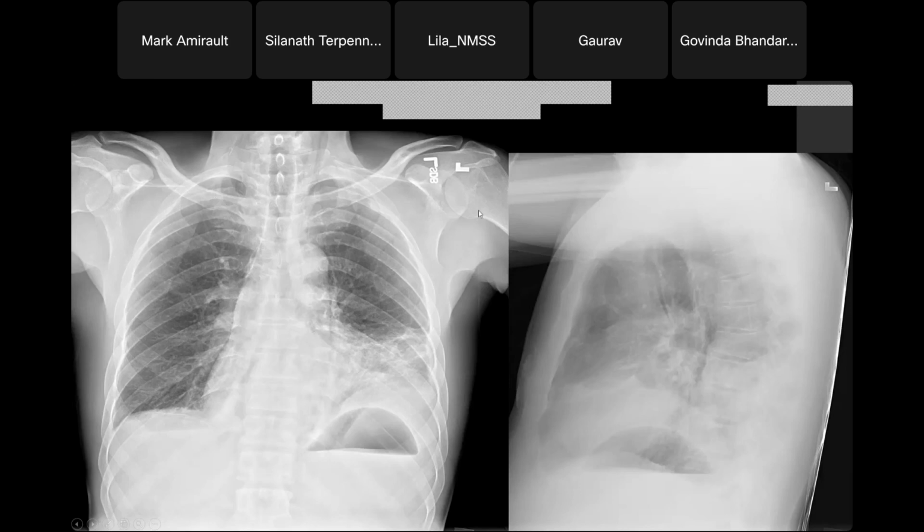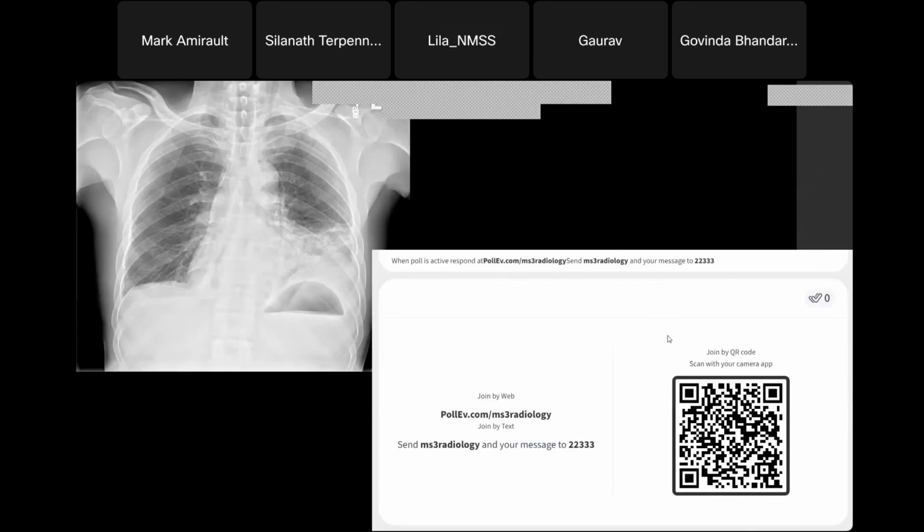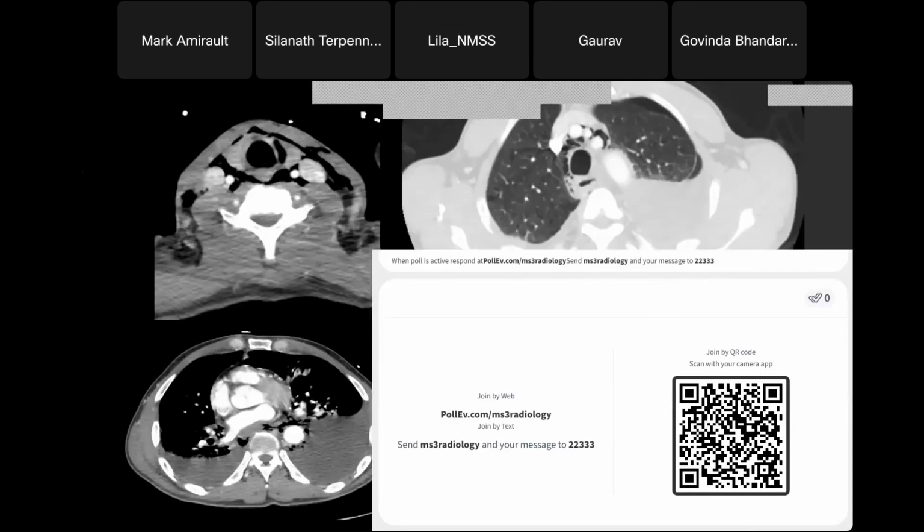Don't see that. And our lateral view just shows me where is this located? Is this in the left upper lobe or the lower lobe? I'll look over here. And we also call this spine sign, just because this should be lucent here, kind of like this. So this tells me these opacities are in the left lower lobe. Got some layering fluid. And otherwise, the spine looks okay. And so we'll skip this particular thing.